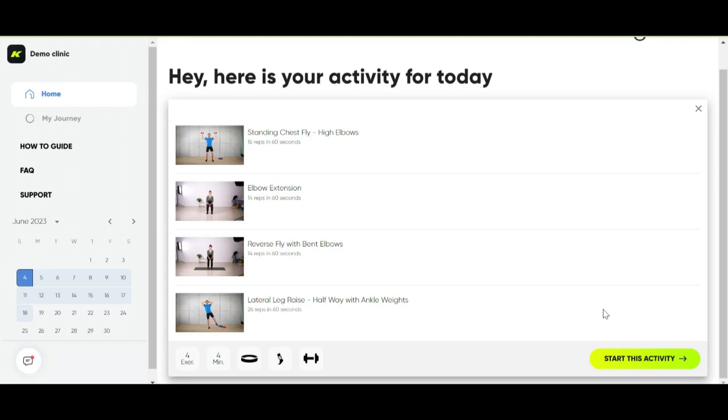They actually won't get any scores or immediate feedback because the system has to run the motion tracker when they are exercising. So just looking at these exercises and doing them without running the activity itself actually misses most of the advantages of using Kemtai.